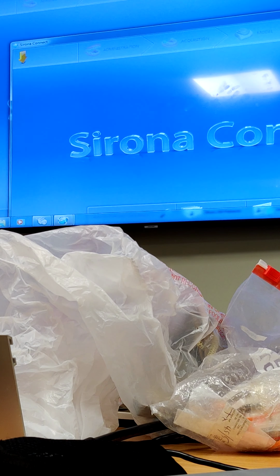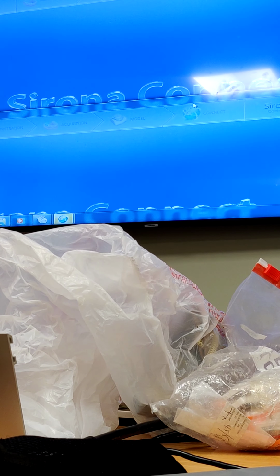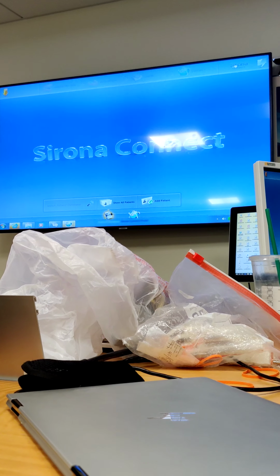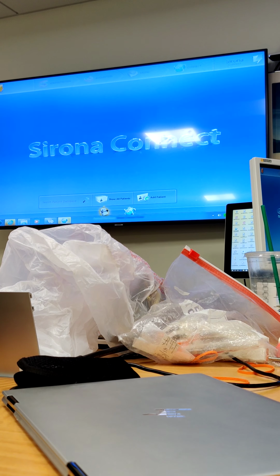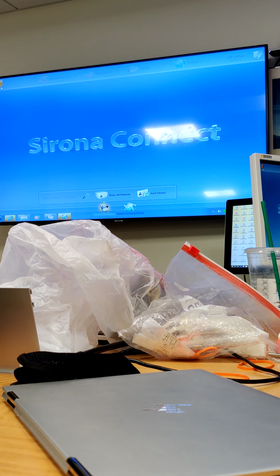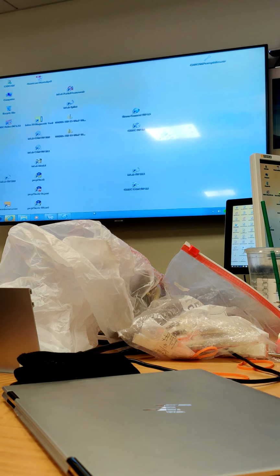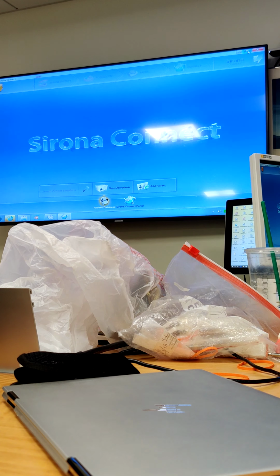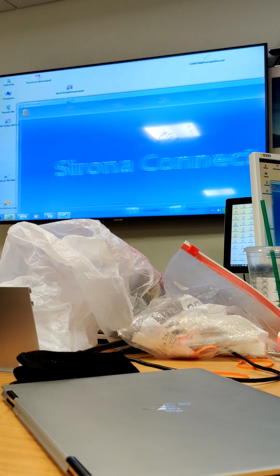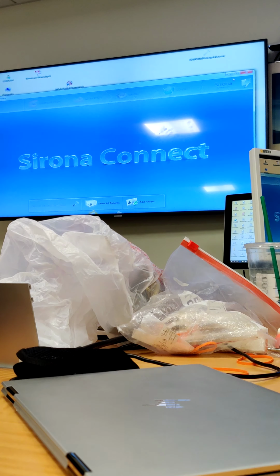If you look here, do you see how I can't see anything, right? Okay, if you want to, you can put it in Windows mode. And that is, drop this down and hit Windows mode, and now I can minimize and maximize, okay? You see, I can turn it off, I can shrink it, I can do basically whatever I want to with it by putting it into Windows mode. Or I can take it out of Windows mode.